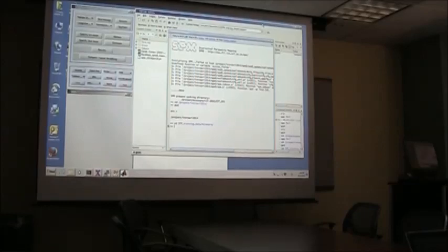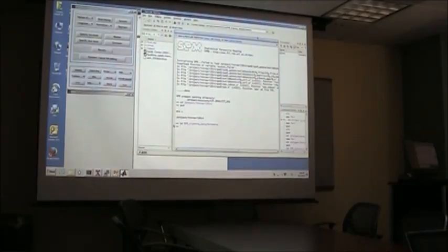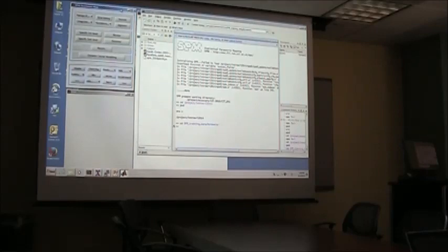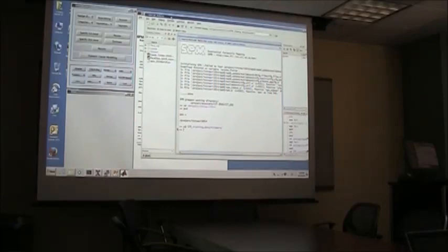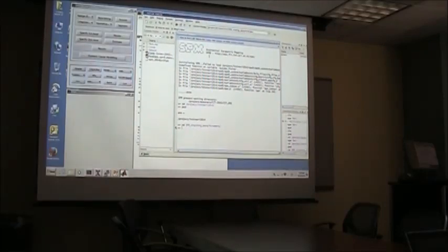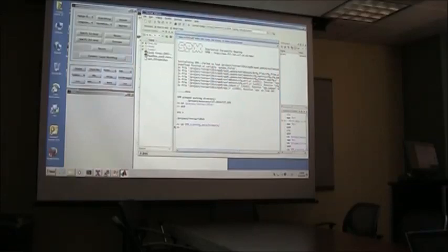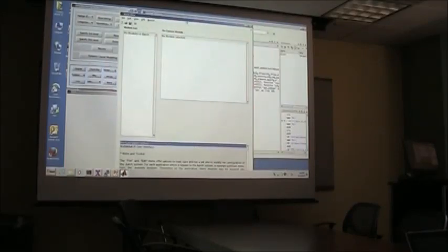What I thought I would do is, last week we looked at the pre-processing, so I'm going to show again how this pre-processing job is set up and saved. There were also some questions last week about how you can run those types of jobs more efficiently. So let's pull up one pre-processing step.